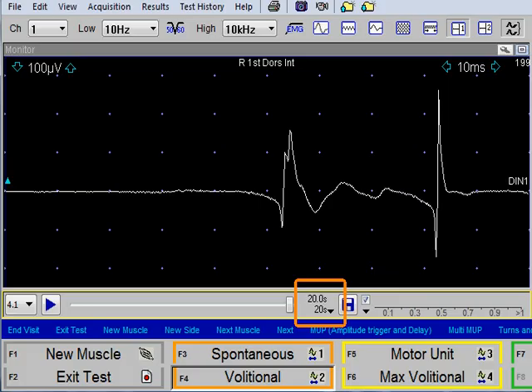Next we have 2 numbers. Both of them indicate 20 seconds. The top number will indicate how much EMG signal we have recorded so far. So in this case we have recorded 20 seconds of EMG activity. The number below it gives us the default setting of the buffer for the live play. If necessary, we can change it. Click on the down arrow key and select a different setting. We can select up to 360 seconds or 6 minutes.